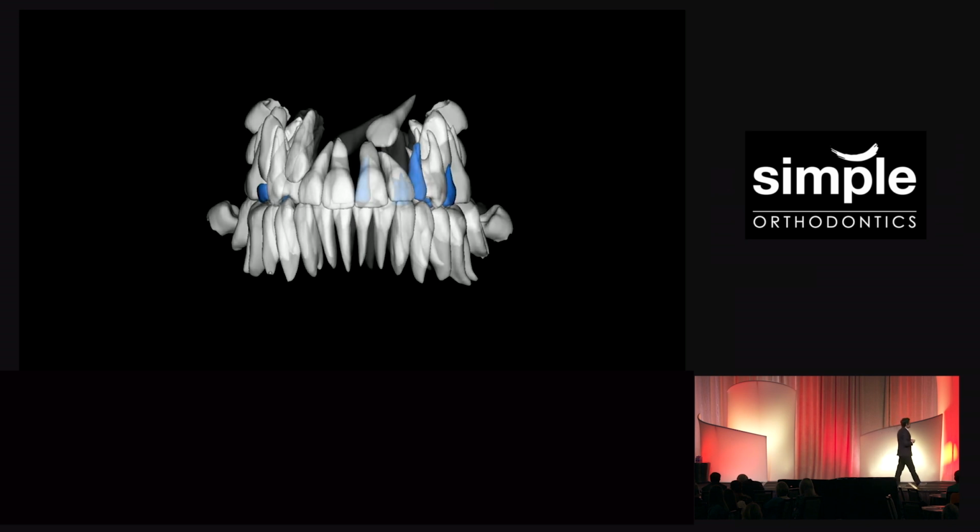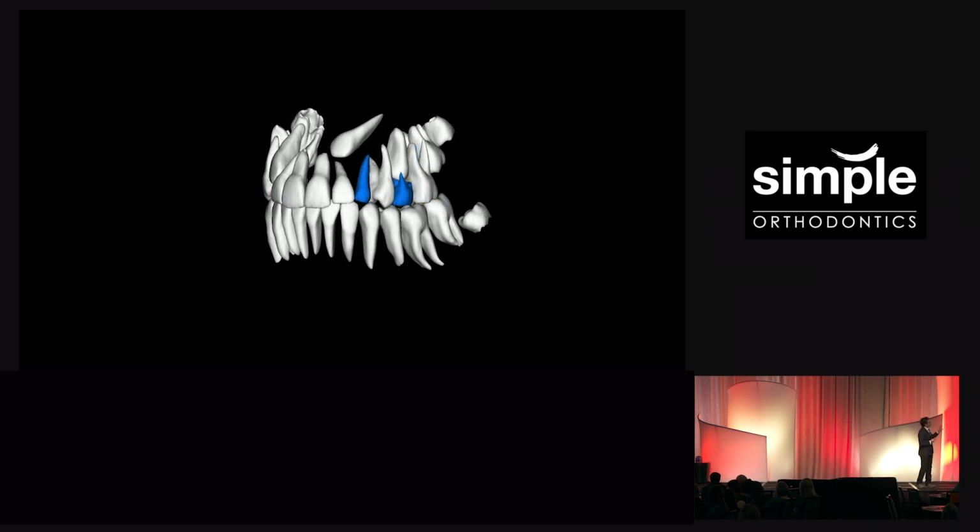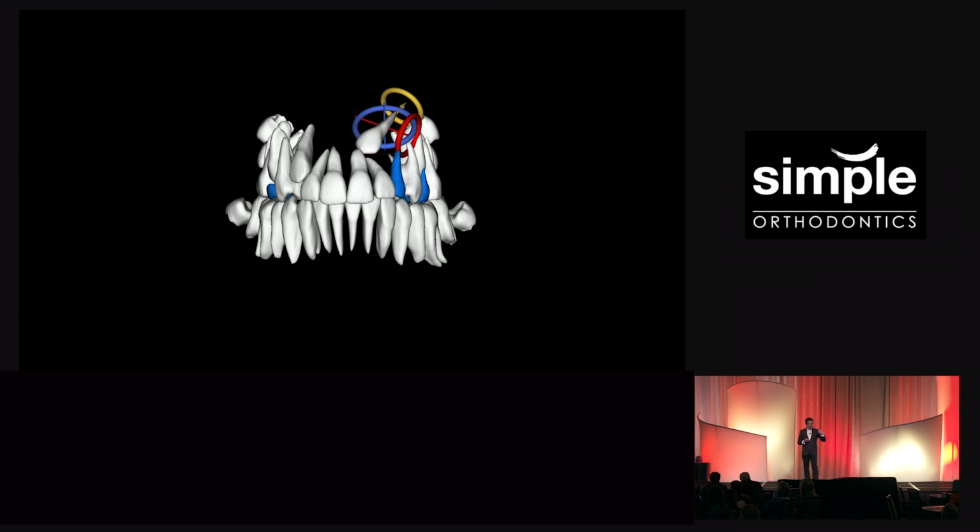So here's how we plan. Our software allows us to put a widget on the tooth, so we can place it on that canine and reorient it along the long axis of the tooth, and I can move it to where I think the center of resistance of that tooth is. And I can angle that widget any way I want so that I can simulate my mechanics. The way I was taught to de-impact canines was strap up the case, push coil at the canine site. As soon as you've push coiled, send them to the surgeon, start pulling.